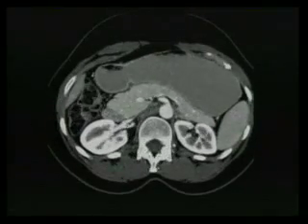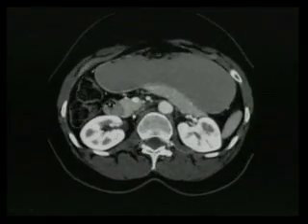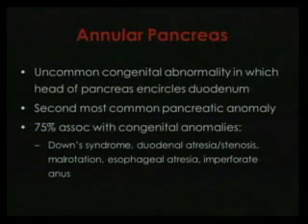This is the biliary, and then this one is the Santorini. Did you see? 3 different ones. I think in this image, 1, 2, 3, separated. It's an anatomic variation, but it increases the risk of pancreatitis.